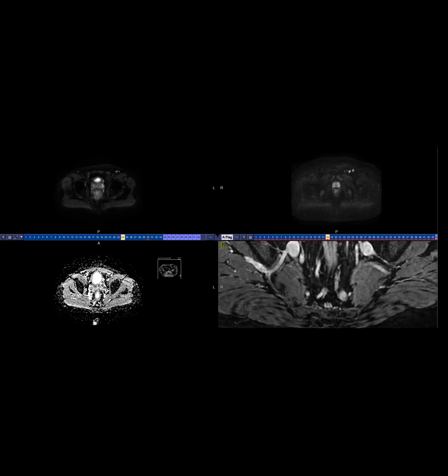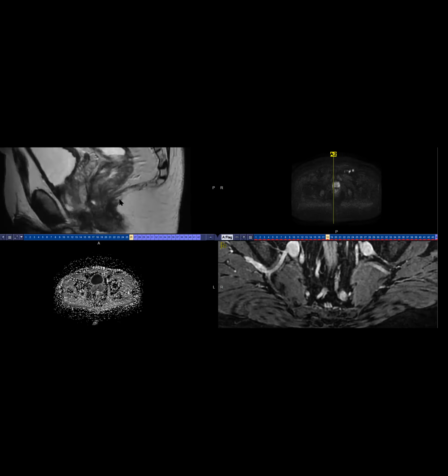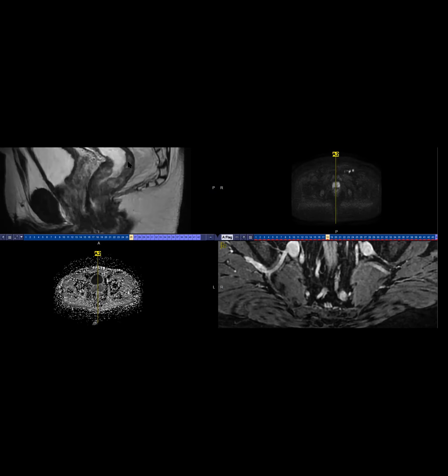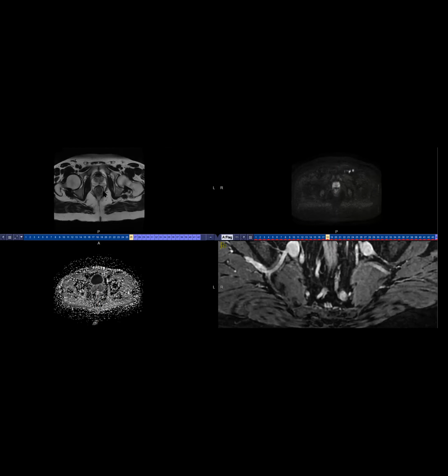There was some signal, just edema mainly, but the thickening did look real on the T2. It did look real, like what we'd see with masses, and it did look mass-like. Yeah, it wasn't very diffuse. You see the rest of the rectum and even the sigmoid were completely fine, and the stranding wasn't circumferential. It was very at focal areas. And I'll show you the other T2s, but the edema was certainly maybe more than usual.